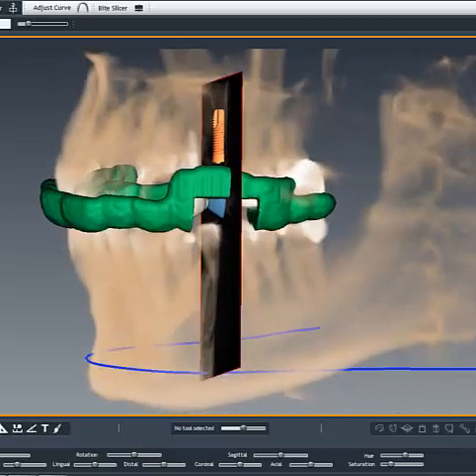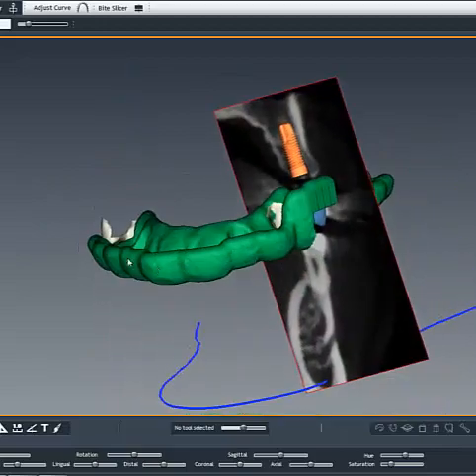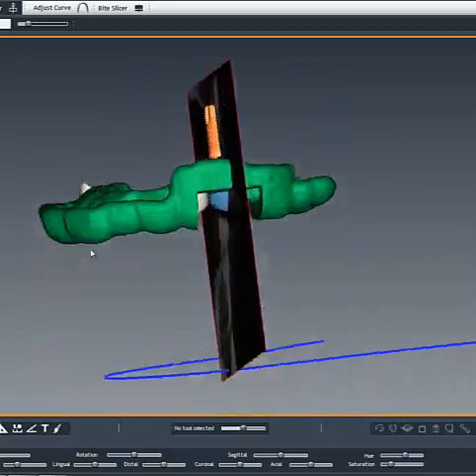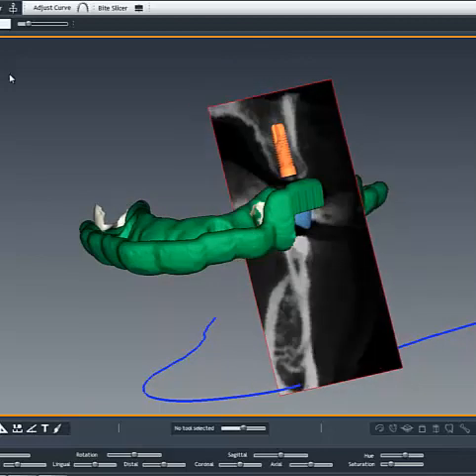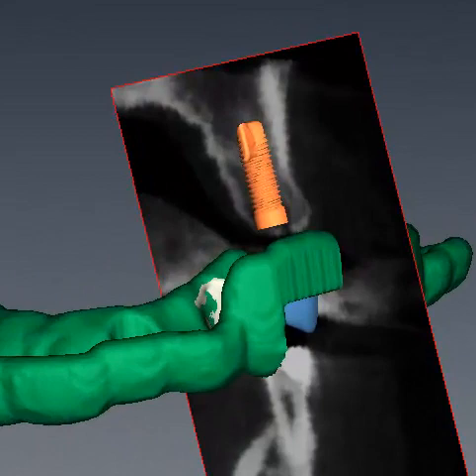If I were to quickly remove the volume view and look at it again one more time, this is the implant that we have that's going to go relative to the position of the surgical guide that will snap on. And now if I were to quickly just start the spinner slice to verify it, I'll slow it down just a little bit to make sure that we can take a closer look at it.